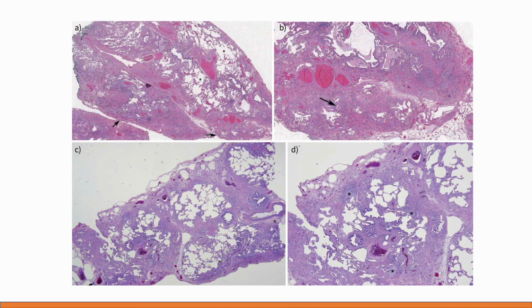Here we go. So this is the honeycombing, and this is the normal parenchyma, and it involves the paraseptal, or it involves the subpleural parenchyma. The visceral pleura is usually not the one that is more involved.